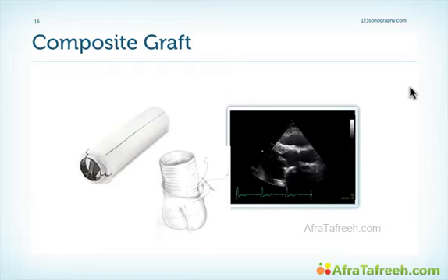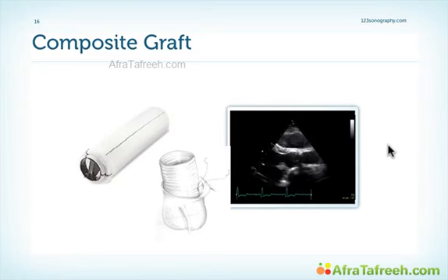In reality, to tell you the truth, it's very difficult to really see the tube part of the graft. We can easily miss it. Therefore, we have to rely on the correct referral diagnosis and referral information as to what has been operated.